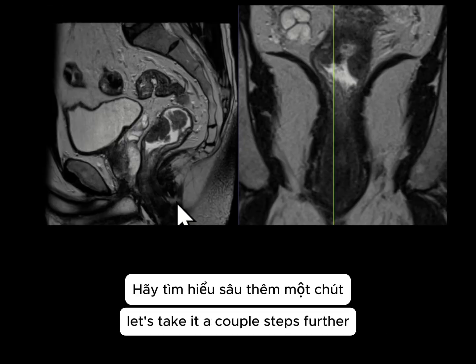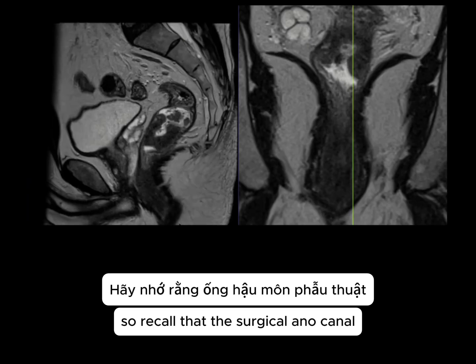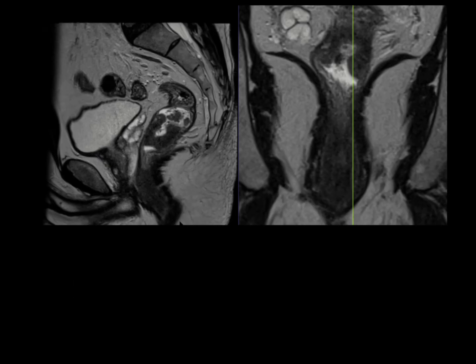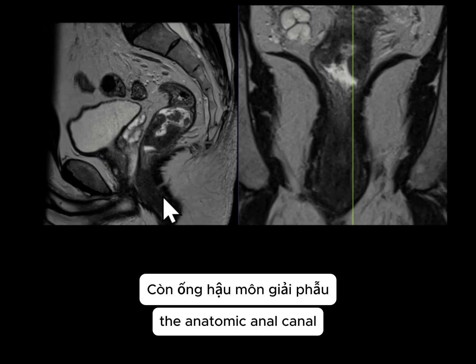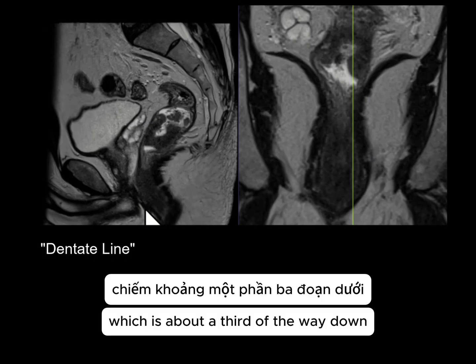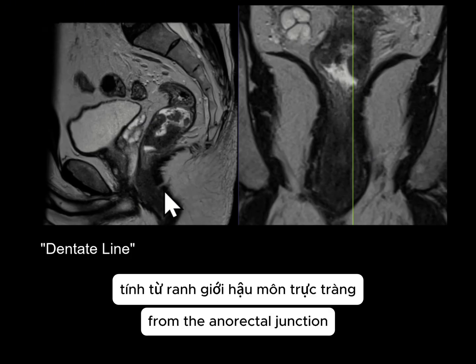Let's take it a couple steps further. Recall that the surgical anal canal is from the anorectal junction to the anal verge. The anatomic anal canal is below the level of the dentate line, which is about a third of the way down from the anorectal junction.